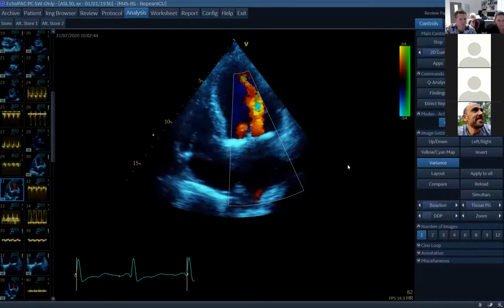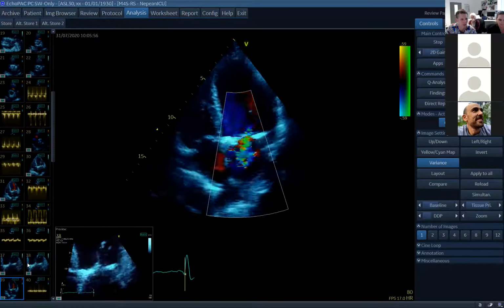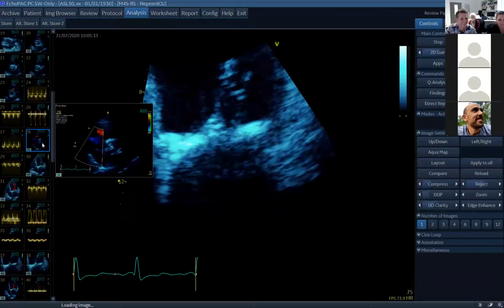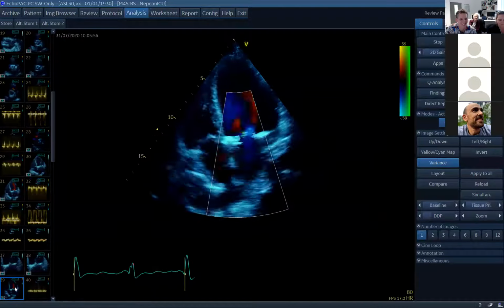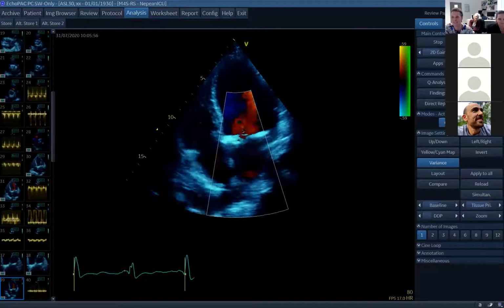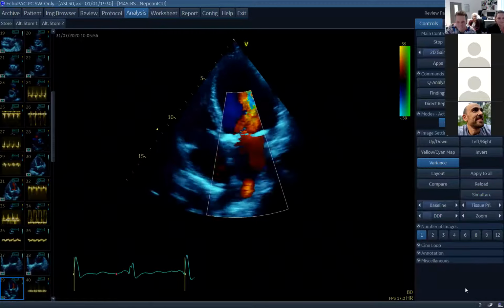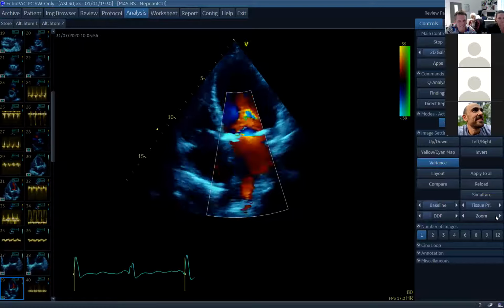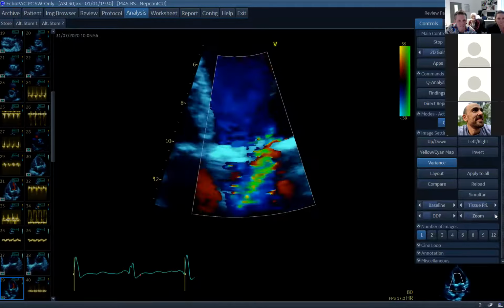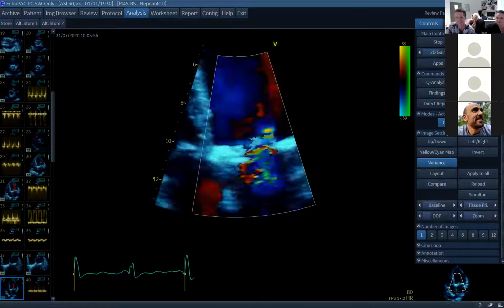Lewis, I've got this for you. Yep. Lewis, how... You're going to love this. It's out of that. All right. How severe is the mitral regurge, based on the apical 4 chamber with color? I don't know if I can zoom it in for you. Nice.